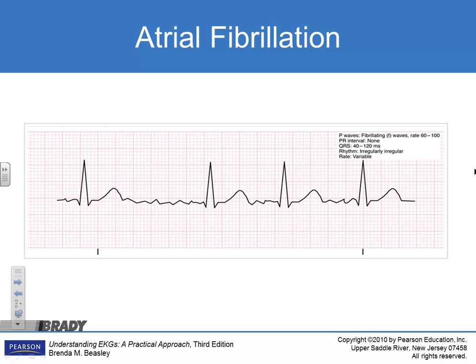All right, AFib, what have we got here? Another example of AFib. Now, why is this not flutter? Those look kind of pointed to me. Some of them do. It's probably within normal limits, though. If you measured it, probably within normal limits. I'd have to get out my stuff. But it's definitely not regular. You can't identify any type of P wave or consistent F waves that kind of look alike.